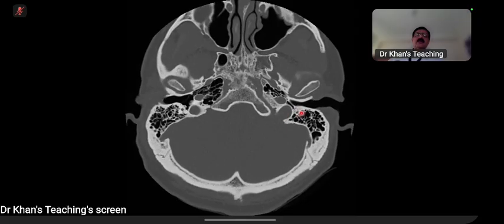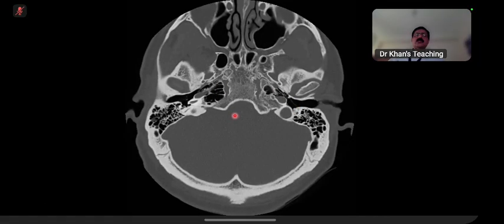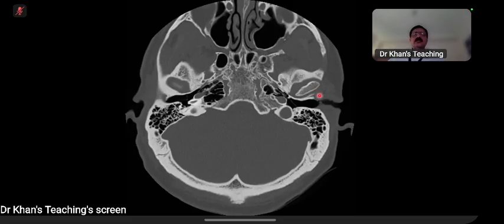And in this particular case, the petrous apex is pneumatized. Please remember that can happen. So there are air cells, just like here, there are air cells here. Actually, on the right side, there are more. So this is just normal variation. As a landmark, this is the external auditory canal. Anterior to that is the TMJ, and this becomes a FRCR checklist, because they will show you trauma cases in which this will not be sitting where it should be sitting. And on an axial sequence, you should raise the issue that it is dislocated.